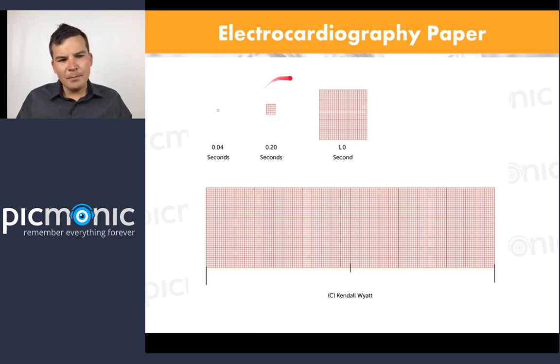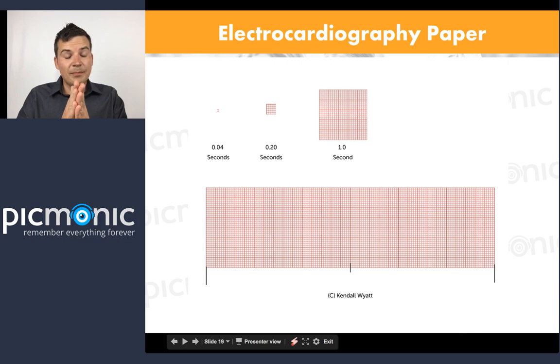What is so important about this 0.2 seconds? What's so important about that one? Why is that such an important number? Well, that's right. The 0.2 seconds is where we measure heart blocks. We're measuring that period of time, and that measures heart blocks, and that's exactly right.